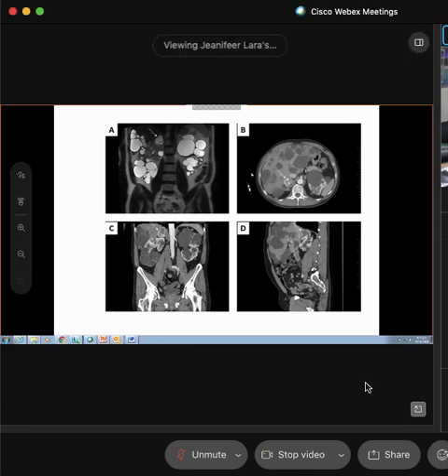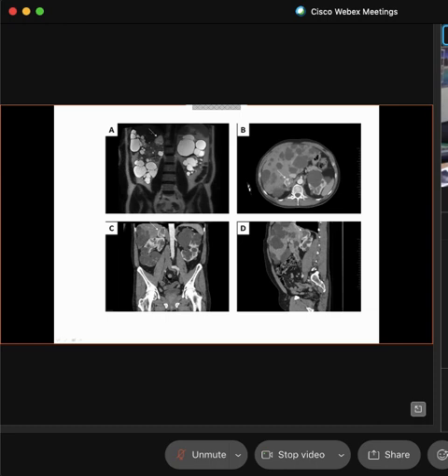So when you start to see masses like this, bony material or anatomy like this, and you start to see other items, it gives you an idea of where you're at in the body. So what side is this that I'm pointing to right here? You can say it out loud.